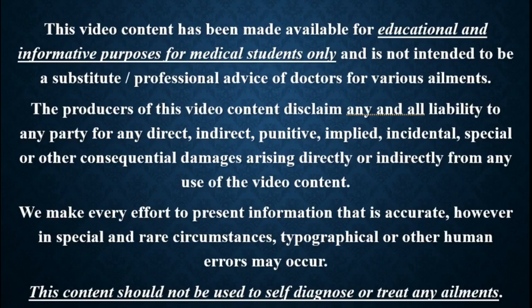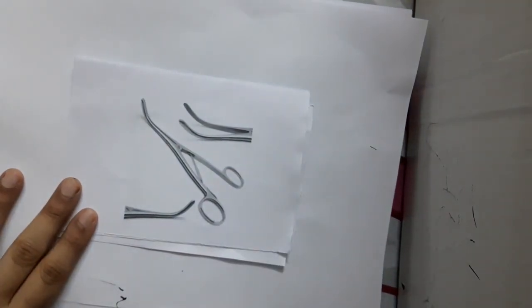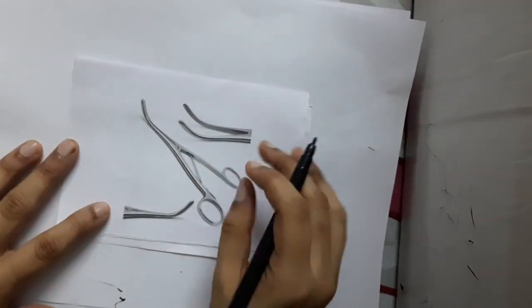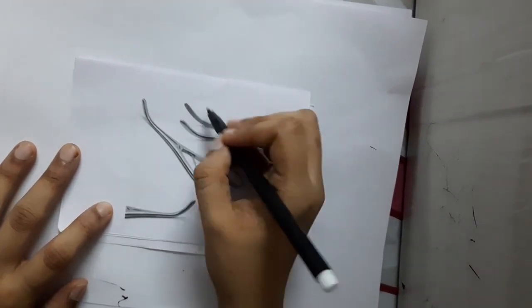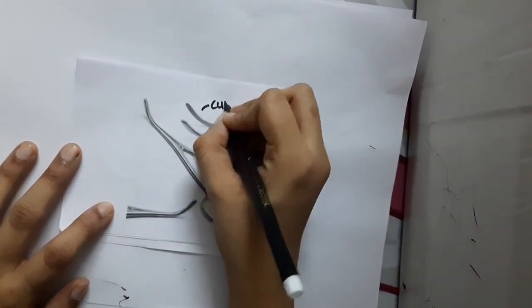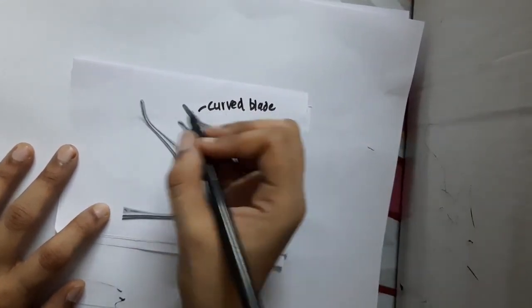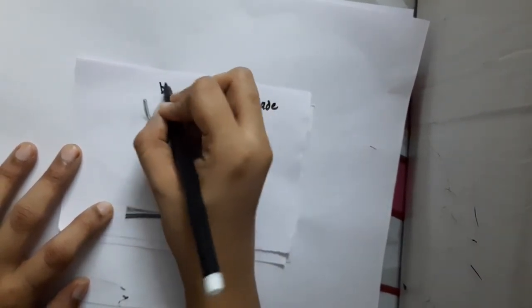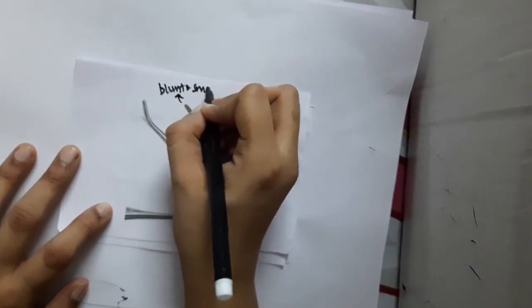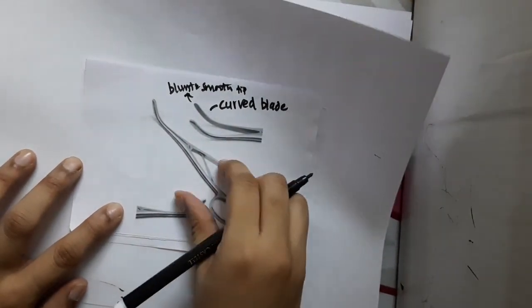In this lecture, we will learn about identifying the instrument. So what is this instrument? Number one, you will see this is a dilator. Actually, you will see that the blade here is curved. You will see the presence of a curved blade, and the tip is blunt and smooth. And there is no catch. It is actually a dilator.